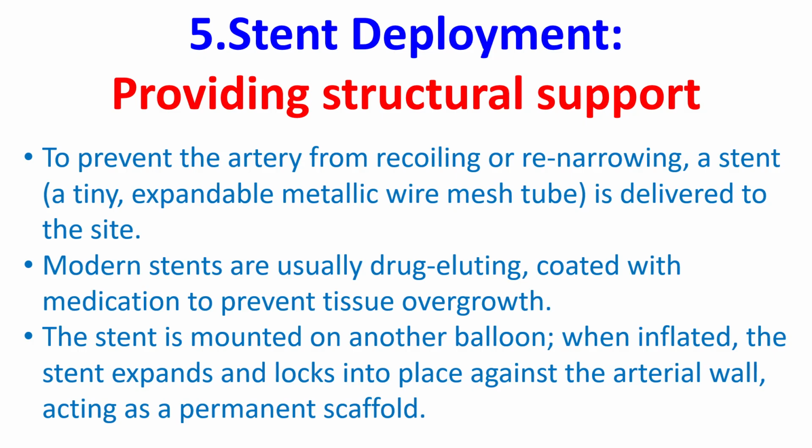Stent deployment, providing structural support. To prevent the artery from recoiling or re-narrowing, a stent, a tiny expandable metallic wire mesh tube, is delivered to the site. Modern stents are usually drug-eluting, coated with medication to prevent tissue overgrowth. The stent is mounted on another balloon. When inflated, the stent expands and locks into place against the arterial wall, acting as a permanent scaffold.